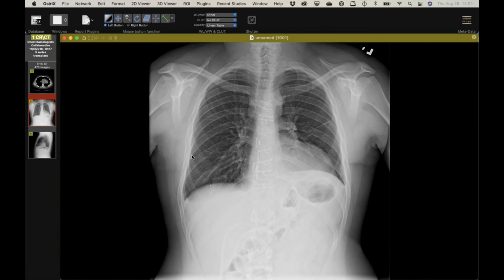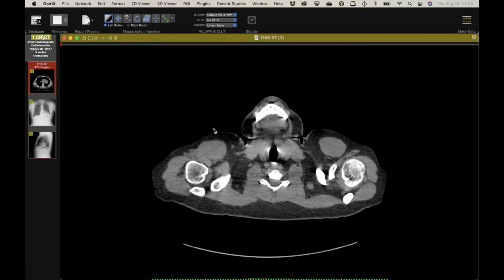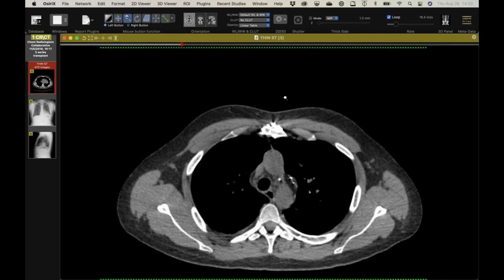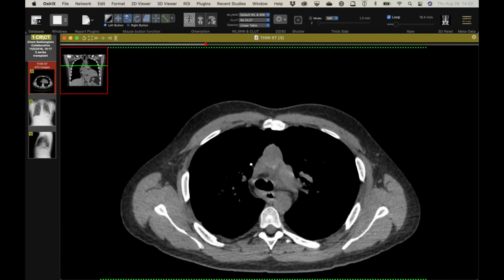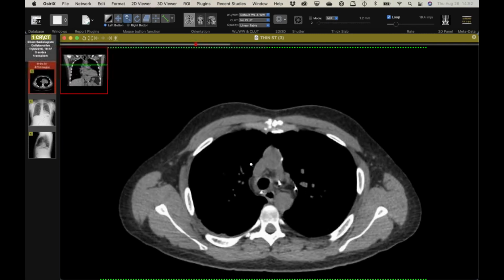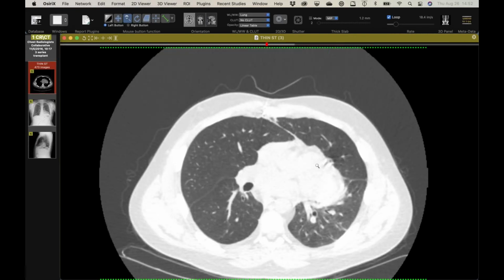We actually did an en-bloc heart-lung, which we have not done in, oh boy, 15, 20 years. But he's got an interesting looking radiograph. He's got this very narrow mediastinum and a funny orientation of his heart. And if you look on the lateral, clearly looks like almost an absent pericardium or partially absent pericardium. And this was his CT. And what's kind of cool is something, because we don't see this, because we don't do en-bloc transplants, is that you can see the airway anastomosis is actually at the trachea. And then there's the aortic anastomosis, but his heart kind of floats in space like this. There's the anterior junction line.